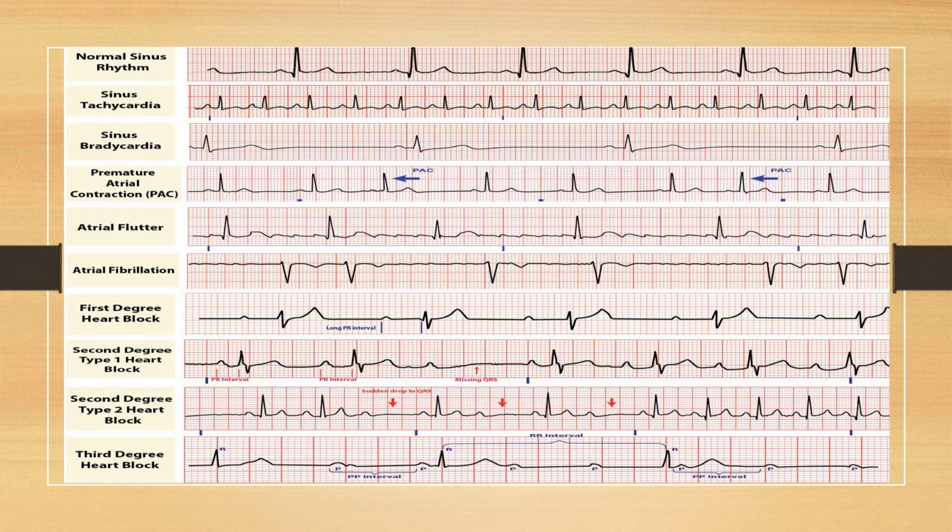Okay, let's look at the next one. Is there a P wave before QRSs? Yes. The first one. Second one, yes. The next one, yes, there is a P wave before the QRS, and so on and so on. So why are we calling this premature atrial contraction? So the third beat, or the third QRS, came a bit early, okay? It arrived a bit early, and the P wave doesn't look like the other P waves.